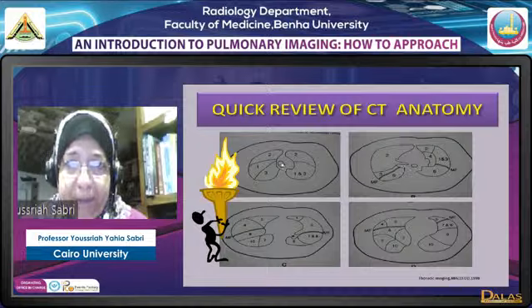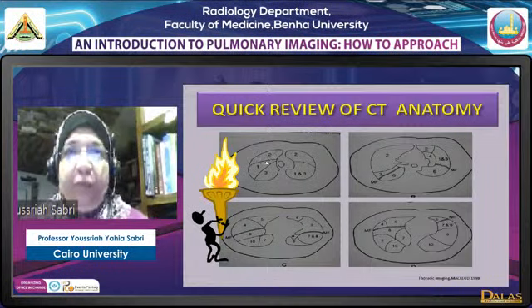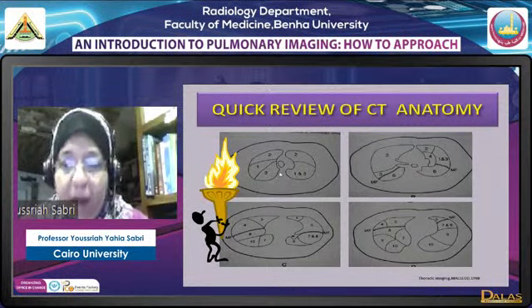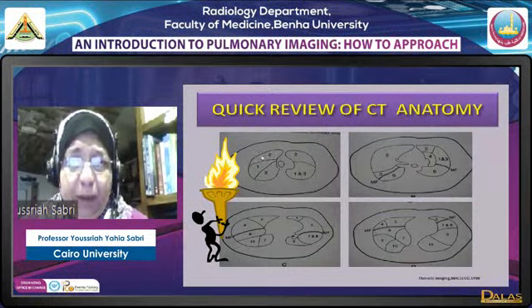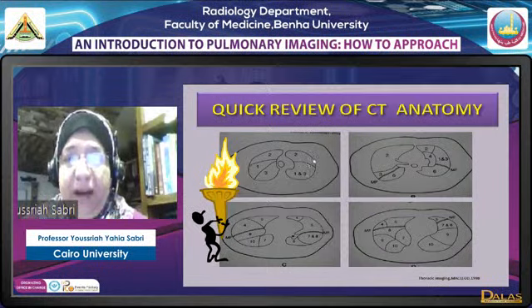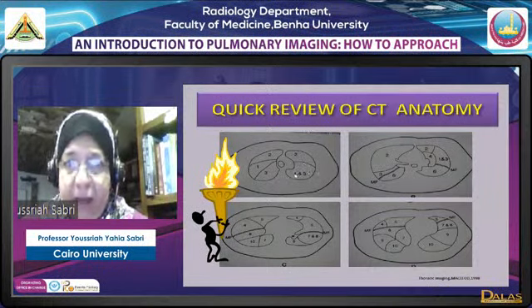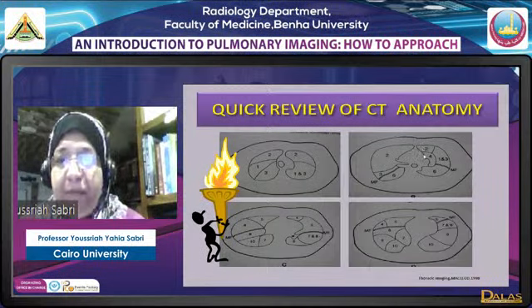As long as I see the airway in the mediastinum, I'm having upper lobes on both sides. The upper lobe, at the very top, is the apical segment. Then after that I have the upper lobe anterior segment anteriorly, posterior segment posteriorly, and an apical segment in the middle. While on the left, anterior segment and apico-posterior segment. Okay. Then we have the fissures.